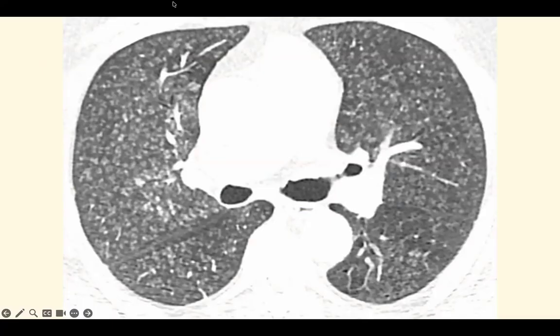Now, after discussing the nodular pattern in the session concerning nodular pattern appearance, we know this is centrilobular distribution. No nodules along the fissure or the costal surface. They are evenly distributed from each other.